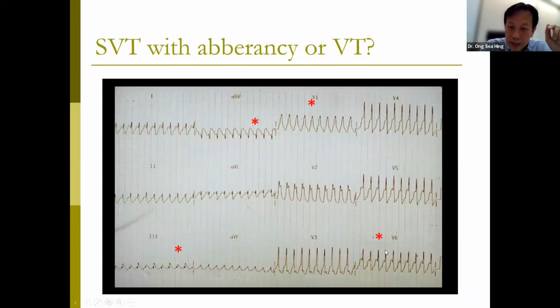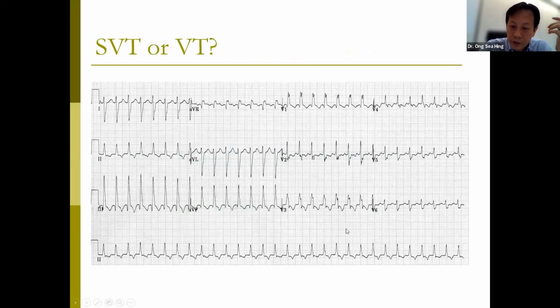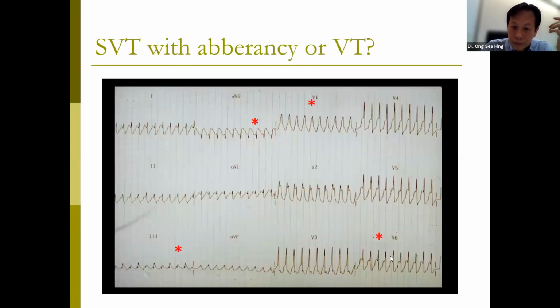So what is this? Is this VT or SVT? So how do we tell whether this is VT or SVT?